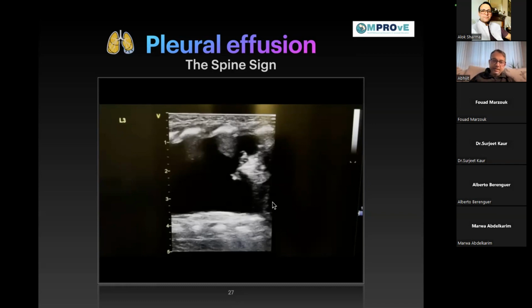Yes. So if it is a chylothorax, you're going to see a similar kind of picture as you are seeing here. Because at the end of the day, is it a chylo, transudate, exudate, or for that matter, hemorrhage? It's a fluid, until the hemorrhagic fluid has reorganized. I'm going to talk about it in the pulmonary hemorrhage section. But anyway, the bottom line is those are all fluid. Chylous, transudate, exudate, all are fluid. So any fluid on lung ultrasound is black. You see blackness. So that's an anechoic area.